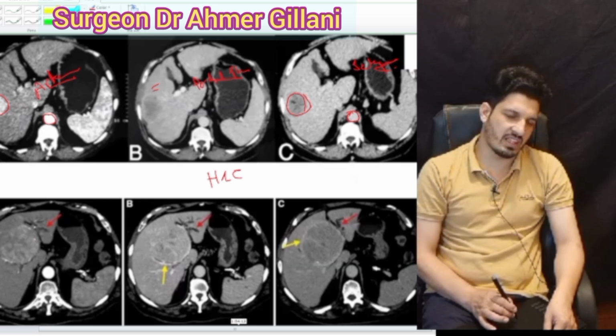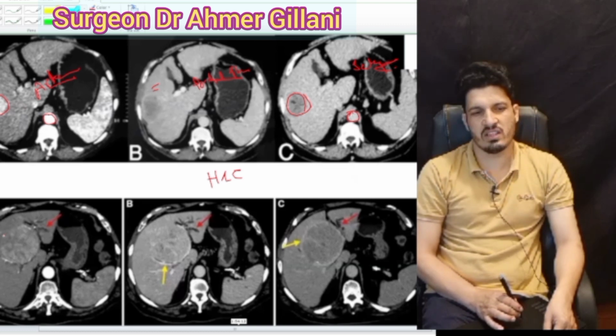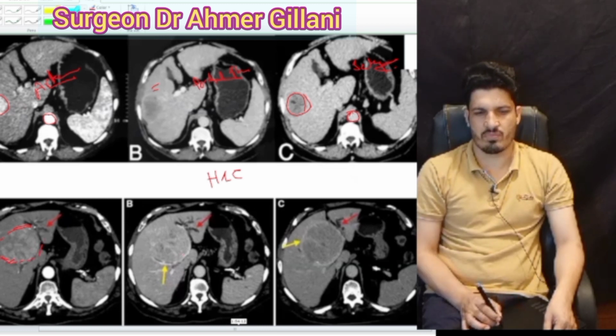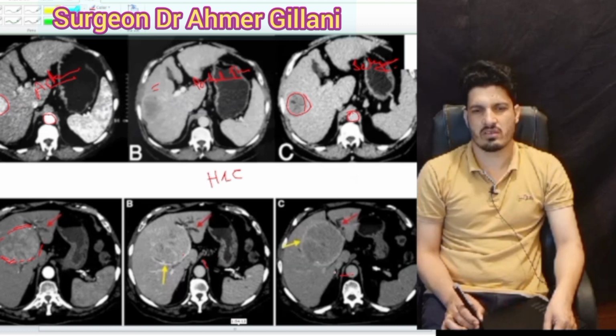These diagrams, they are just for comparison, that it's not necessary that all of the lesion becomes bright. Sometimes only wall of the lesion become bright. So this is a contrast. And again, this is the portal phase, and this is the delayed phase.